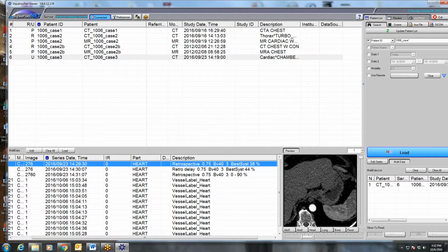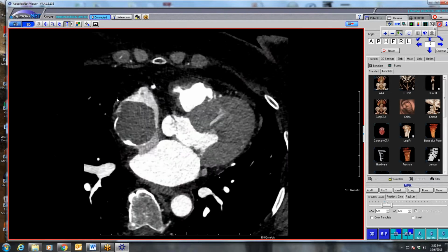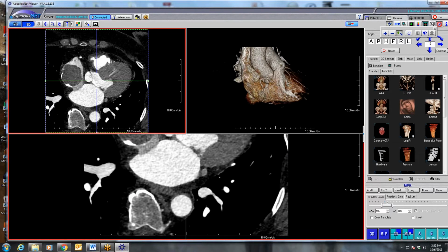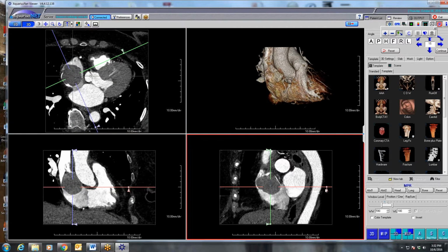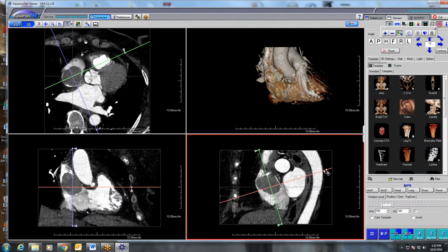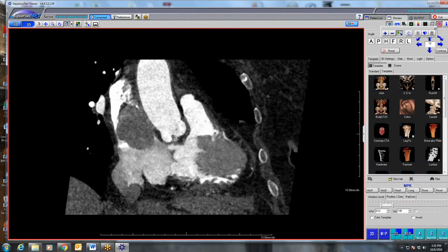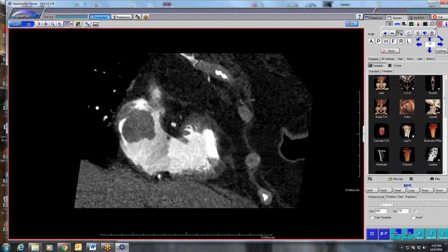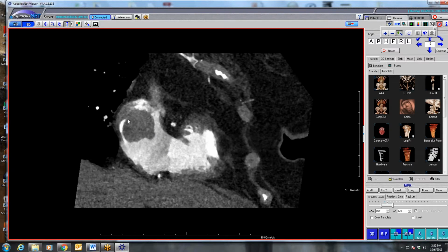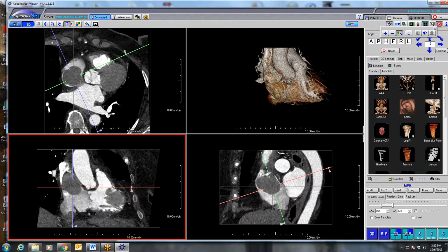So the last case was a case we had when I was away, and it's interesting. I've seen, I think, de novo, a lot of left atrial myxomas, 4 right atrial myxomas, and 2 of those right atrial myxomas happen to be within the past month or so. And this one is interesting because there's a posterior stalk here, arising very, very high in the right atrium and kind of into the superior vena cava here.